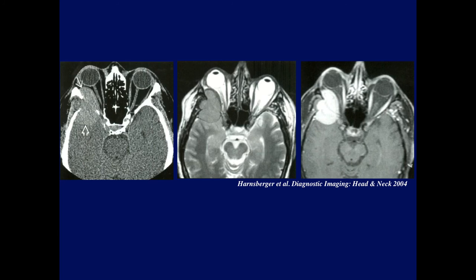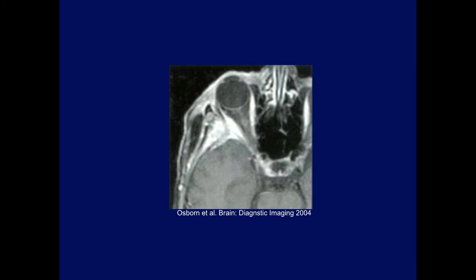Oh, somebody's writing something. Langerhans, not bad, but this was a plasmacytoma. Another case, this was already mentioned before in the differential, lymphoma.